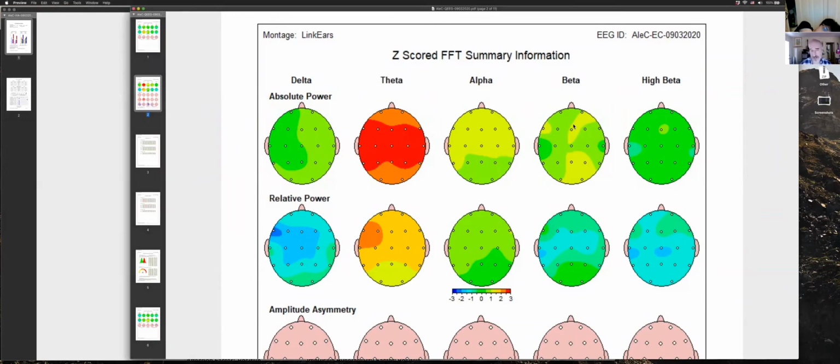But they're connected, and they're both part of what is called the default mode network, a part of the brain that lights up when we're thinking about ourselves and how we work internally. It's subjective. These guys are lit up a little bit. So you're kind of chewing through some resources going, what to think about, what to stress about, a little bit, it looks like.